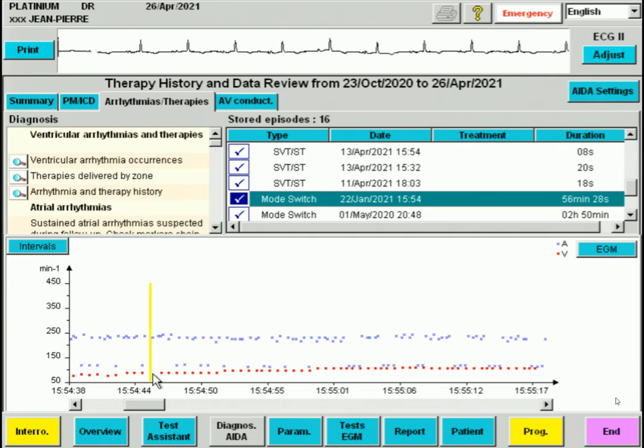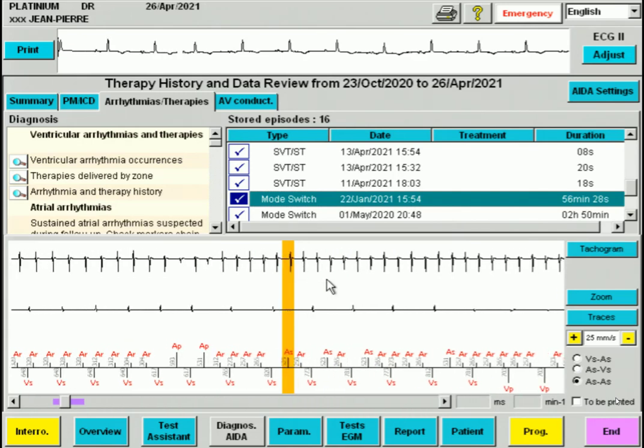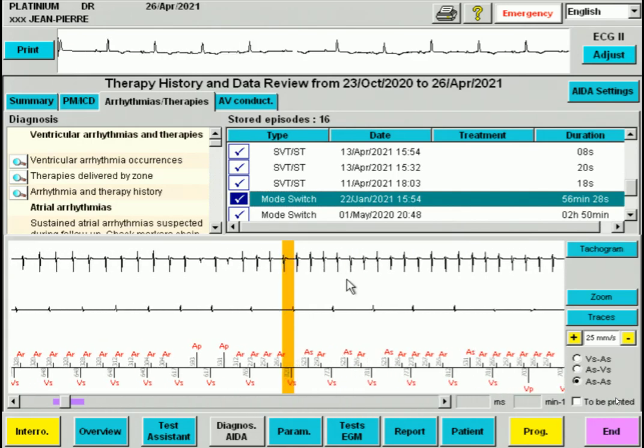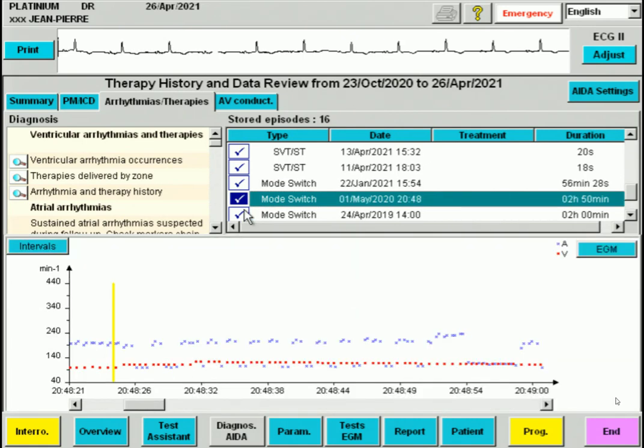We see that the ventricular rate is relatively slow, and the atrial events show a train track pattern. When we open the EGM, we see that it is an atrial tachycardia with intermittent conduction towards the ventricles. And we observe that there are two groups of atrial sensed events. One, the actual sensed fast atrial events, and two, the longer intervals caused by functional undersensing of the prior atrial cycle. This explains the train track pattern on the tachygram.